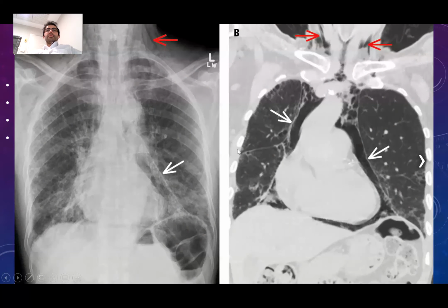That's another case with a CT scan in hand as well. Some pneumomediastinum which is encircling the heart and also going up around the neck as well. This is not pneumopericardium, but if you call this pneumopericardium, I would understand. I will not ask about the differential diagnosis of this. It will be just too much for you. Please stick to the basics and know the basics and don't make any mistake.